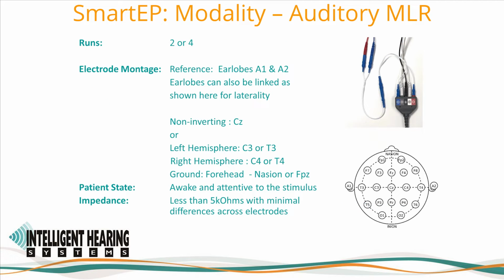The recommended electrode montage is as follows. Reference inverting negative inputs are connected to the earlobes A1 and A2 for left and right ear respectively. The earlobes can also be linked with a linking cable for laterality.